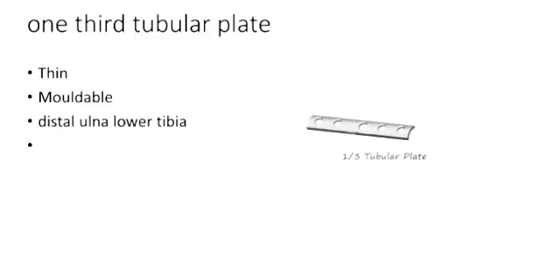In the past, machine screws, that is self-tapping screws, were used, but now AO screws, that is non-tapping screws, are used. A non-tapping screw is better than a self-tapping screw because in the latter, while tightening, heat is produced at the bone-screw interface, causing necrosis of the bone and thus loosening of the screw. For a non-tapping screw, threads are cut in the bone with a special instrument called a bone tap.